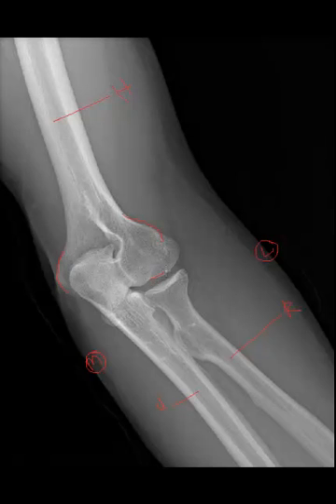Here is the capitulum, which articulates with the radial head. Here's the radial head, and of course the radiocapitular joint or capitellar joint. Here is the radial neck and radial tuberosity. Continuing on with the ulna, well, let's just identify the olecranon fossa, which is the fossa that receives the olecranon process. Now the olecranon process we can see very nicely here. It's kind of this spoon-shaped structure that extends off of the proximal ulna, and this will articulate with the trochlea, which is the condyle, the medial condyle of the humerus, to create the ulnotrochlear joint.